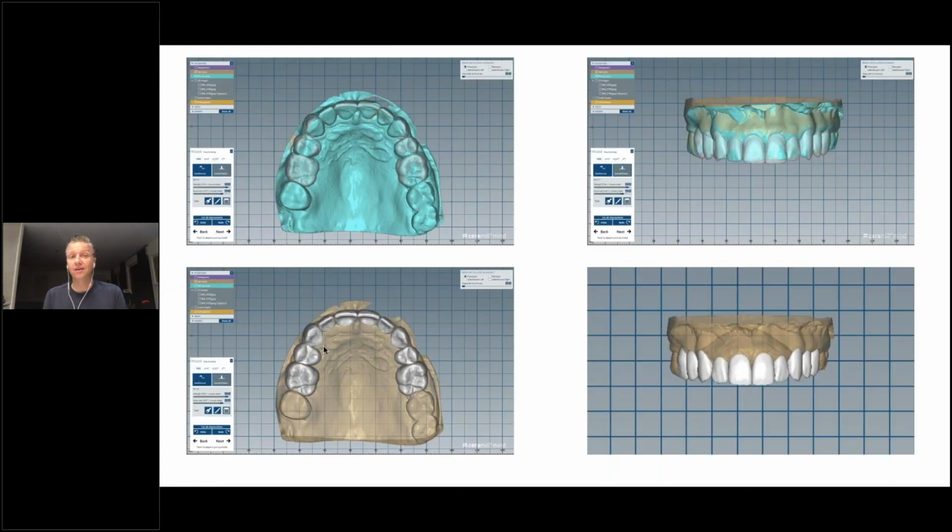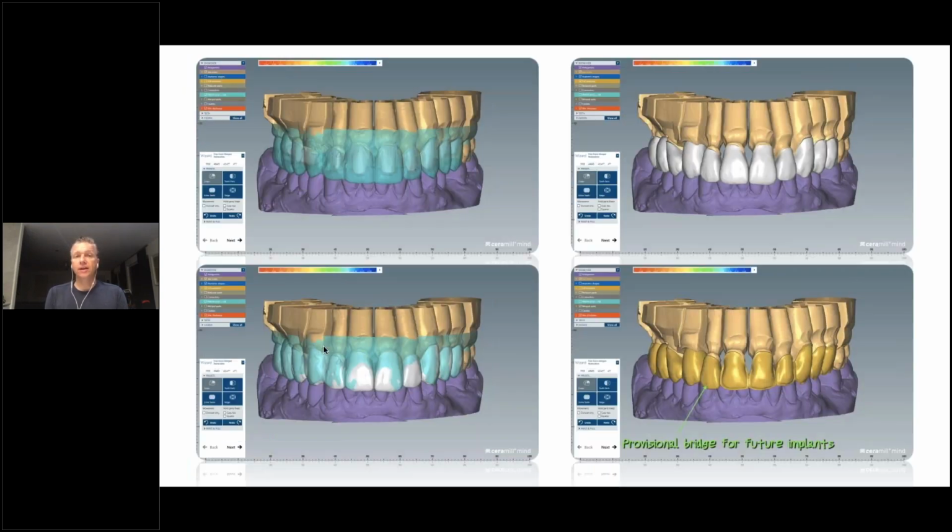From there, I can now create a three-dimensional smile or that three-dimensional diagnostics with these teeth. I can orient now the posteriors, the canines, the molars, premolars, basically to our design and can create a functional diagnostic model. And that allows me then later on, after the patient is prepped and temporized with that diagnostic model, I can now start as well doing the final restoration.